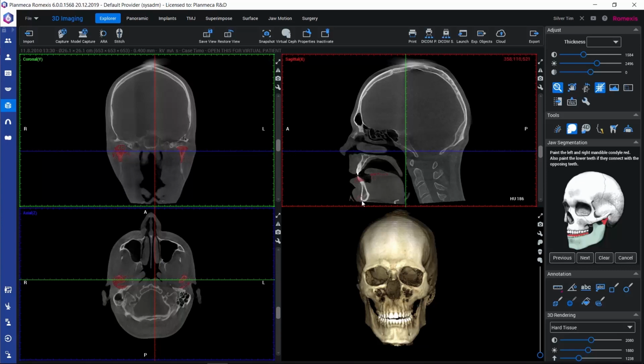So later on, the segmentation starts from here in the mandible, and with the help of this paint, the software knows where to stop the segmentation so that it doesn't continue all the way to the rest of the data or to maxilla. So everything that is painted here will be part of the mandible. So basically, if we would like to get a very exact segmentation result, we might want to check at this stage that the paint is only covering these lower teeth and the mandible, the condylions, and we don't have the paint anywhere in the maxilla or in the upper teeth.